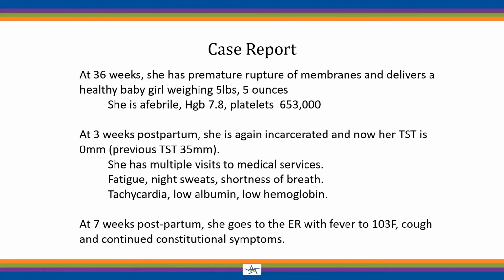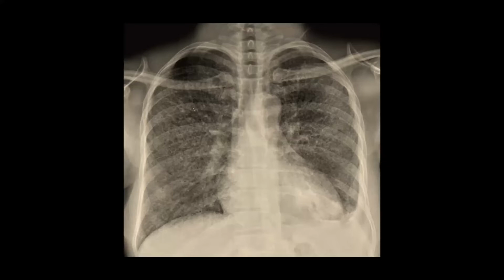But be that as it may, this is not her chest x-ray, but it's very close to her chest x-ray. She had a lovely one, but it didn't project very well. This is very, very similar. So the report was bilateral infiltrates consistent with COVID-19 infection. And I'll just say that it's not like any chest x-ray I took care of, and I took care of a lot of COVID-19 infected patients.